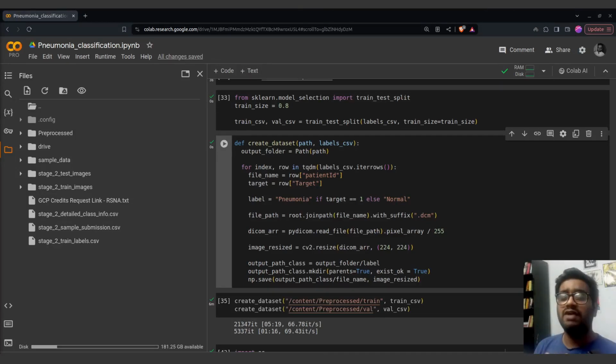Hello everyone. In our last video, we preprocessed our dataset for pneumonia classification with X-ray DICOM images. The video link should be coming right over here. You can just click on it and go there. First watch that video, then come here. In this video, we will start our training process.